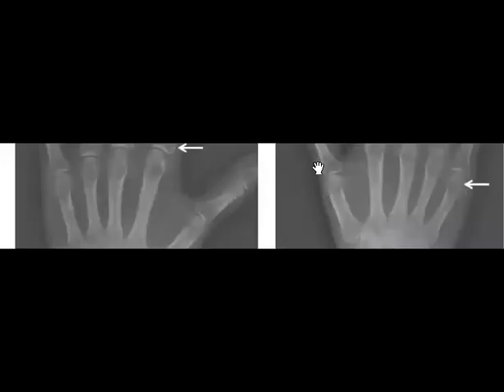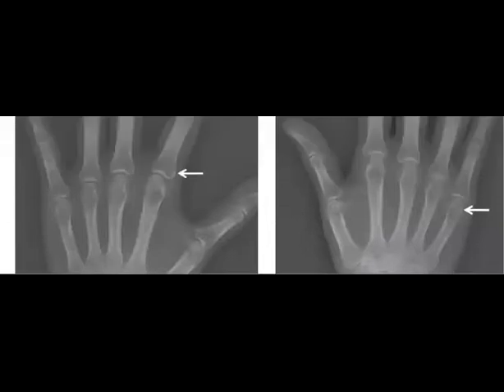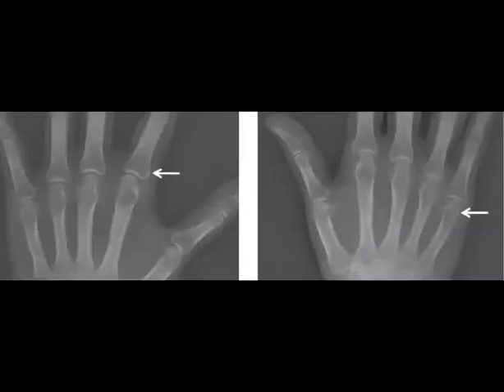Okay. They give you, look at these changes, like erosion changes. It's very subtle. I don't know if you can see it or not, but they mentioned that there is some osteopenia, as you see here, and yeah, you can see it on both sides, and you suspect the erosions. Okay.